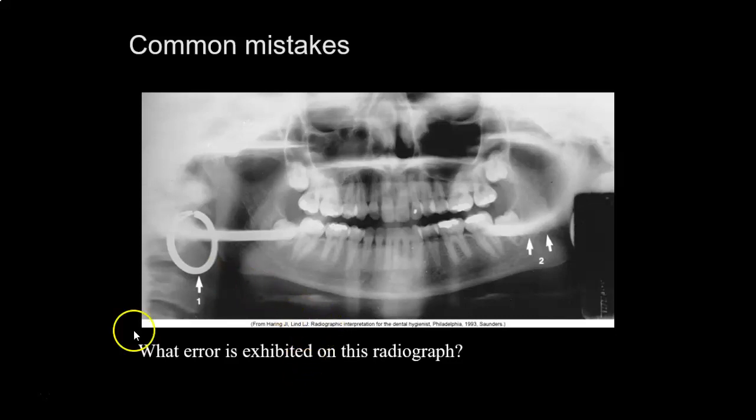If you said ghost image of the earring, you were absolutely right. So here is the original image, and then at the opposite side of the film, higher up and blurry and larger, is the ghost image of the earring.